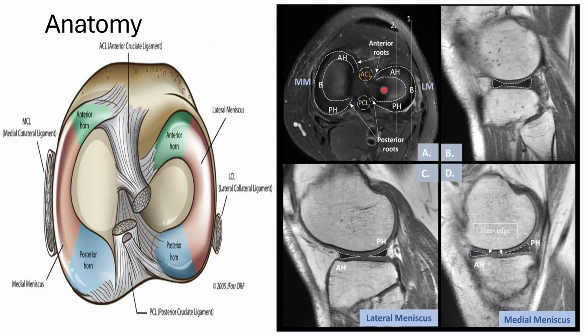Each meniscus has an anterior horn, anterior root, posterior root and body. So these are the parts of the meniscus, and the menisci have surfaces named according to a simple nomenclature which is particularly helpful in describing meniscal tears.